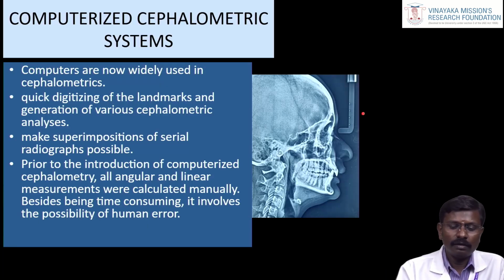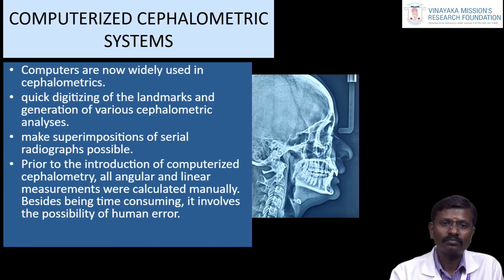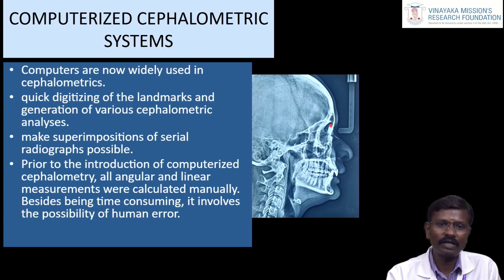Due to recent advances in the field of dentistry, the digital cephalogram has come and plays a major role. It is one of the time-saving tools. With this digital ceph, we can do an analysis directly in the software, and that will give you the readings. In that software, we will get a text box where all the analysis names will be there, like Steiner's, Tweed's, Downs, Ricketts. Totally more than 30 cephalometric analyses are there.